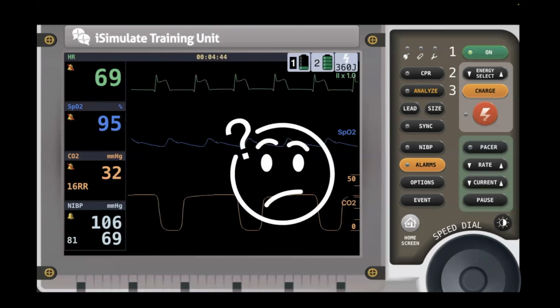How about this one? Man, this just doesn't look right, right? It's wide and bizarre. There's no P wave with it. It is pulsating. Hey, take a look at this. What this one is, is actually a high right coronary occlusion or heart attack in the right coronary artery. And this is what happens inferiorly. So when the heart cells start to die, the potassium that's inside leaks outside in the area where those heart cells are dying. So what happens is you get a localized hyperkalemia or elevated potassium.